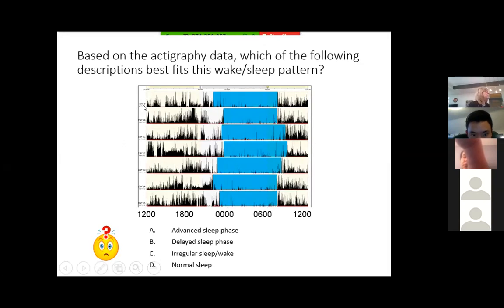Now here is days, and usually it will say the day of the week, we can't read it on here. And I'm gonna tell you the truth, I got these from the Respironics website, and so that's why I can't quite read those. But their pictures are really beautiful. So here's a week of data, and because you couldn't read the time at the bottom, I created something extra, and we're gonna see this pattern in all the other ones we're gonna look at.